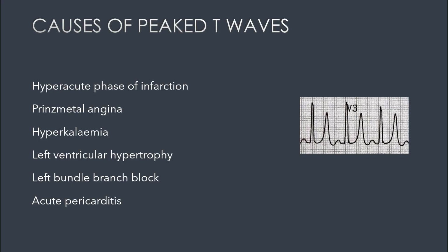Let's have a look at peaked T waves. In the first few minutes following occlusion, the initial stages of the injury drive changes to the repolarization sequence. So as a general rule of thumb, most of the changes we're going to be looking at are going to affect elements of the waveform related to the repolarization sequence. That is, it's going to affect the ST segment or the T wave. The changes that affect the electrical baseline do not happen immediately. Hence, the ST segment changes may take several minutes to occur.